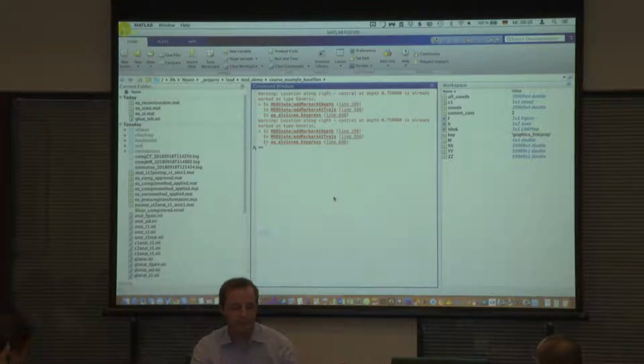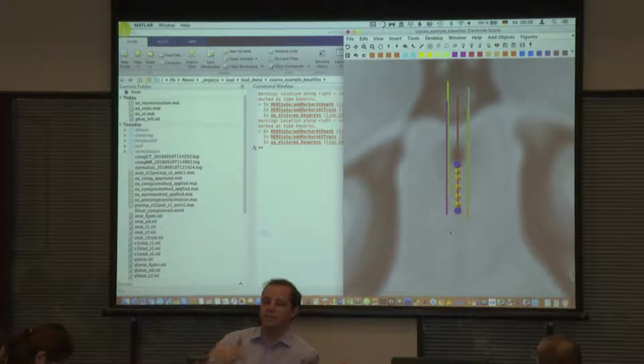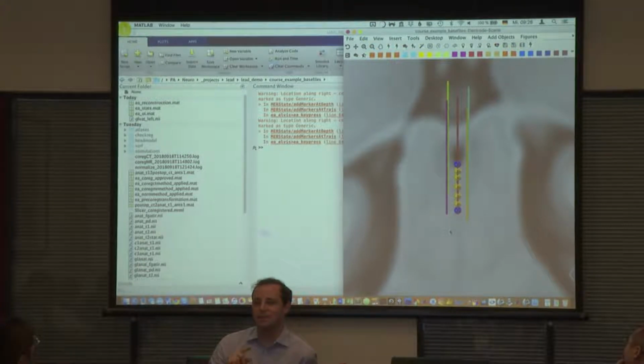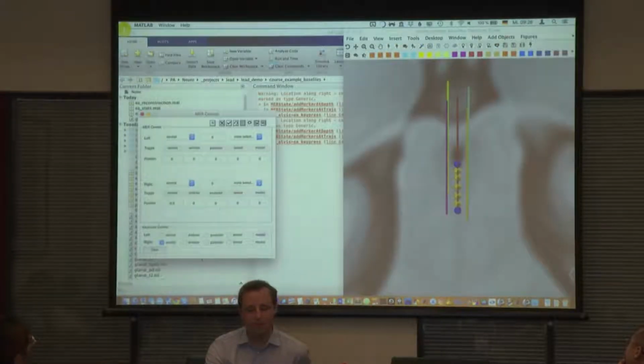Okay, there is generic, it's already marked. But I think T for top of STN would work. So if you press T, it's a blue bubble, and bottom would also be bottom of the STN. And there are also some other functions, and I think these are even documented in the manual on the website. So if you're interested in that, you can play around with it, but that's more or less what I know about it.